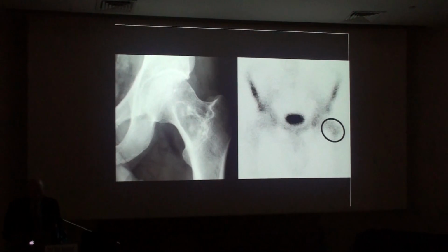Well, usually I make it on MR, although when I see a benign appearing lesion with some ossification within it, particularly towards the end of bone, I always consider a benign fibroosseous lesion, and I use that term because that's how they were classified in the AFIP, under that fibroosseous category. And I think of an intraosseous lipoma in that differential.